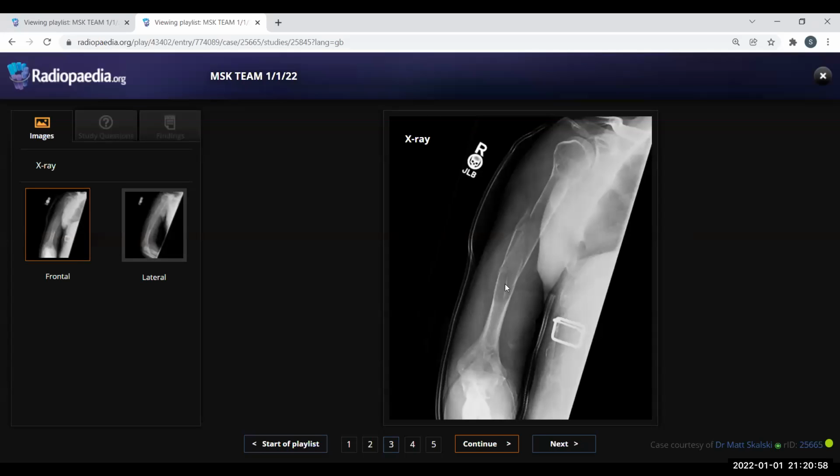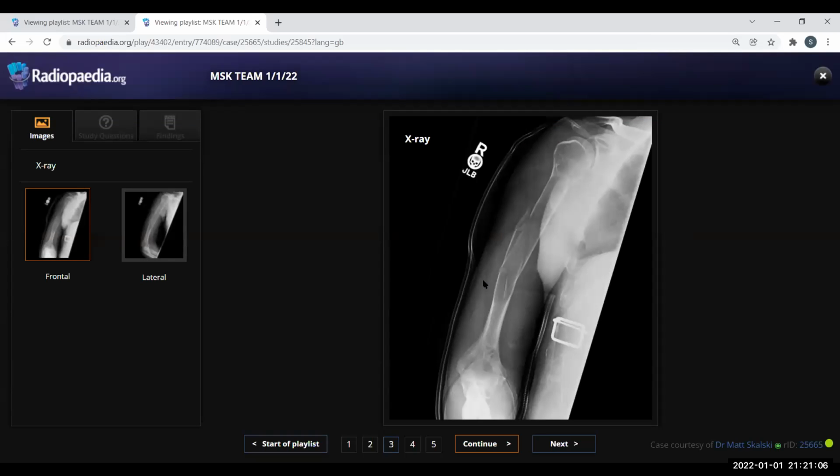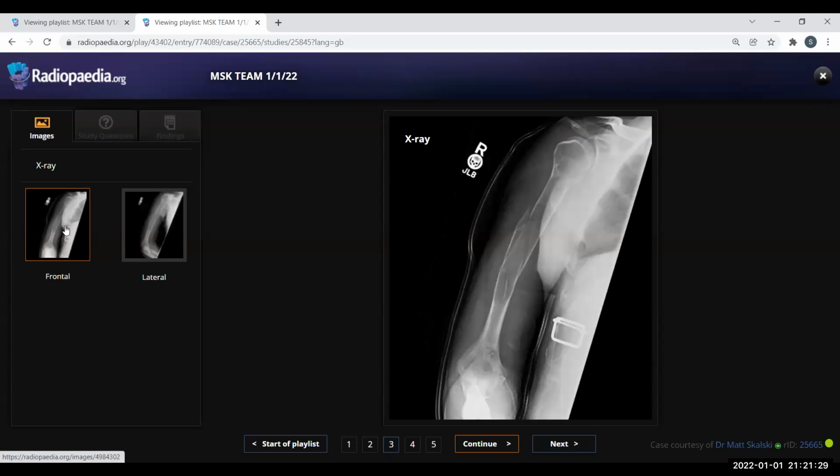Can I convince you? Can you see a dense bone fragment here? Yes. At the dependent part. I haven't seen such a long one. Maybe it's not very clear on the Zoom. So that is why this is a fallen fragment sign. This is a simple bone cyst. And I totally agree. This becomes confusing that this is soft tissue, but actually it's a very well exposed X-ray. So what you're seeing are the muscles. These are the muscles. So there is no soft tissue component. There is only a pathological fracture in a very well-defined, lucent, benign, non-aggressive lesion. And the top of the differential will be simple bone cyst because of the fallen fragment sign.